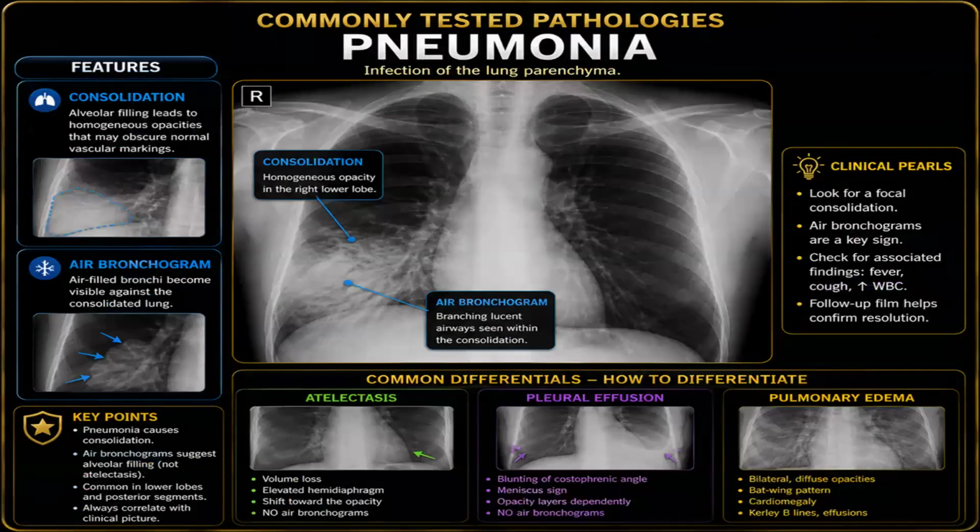Here pneumonia, you will call respiratory specialist, antibiotic, if the CURB score is more than 3. Clear? Okay, so I can see consolidation, this opacity part, and it could be pneumonia. Done. Easy? So atelectasis, also take an idea.